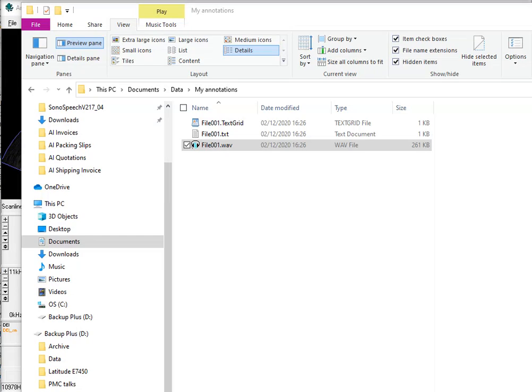This is a tutorial about importing text grids back into AAA. Now, typically, what you want to do is to have previously exported the audio files, the WAV files, from a session that you've recorded in AAA, which may also have ultrasound data.